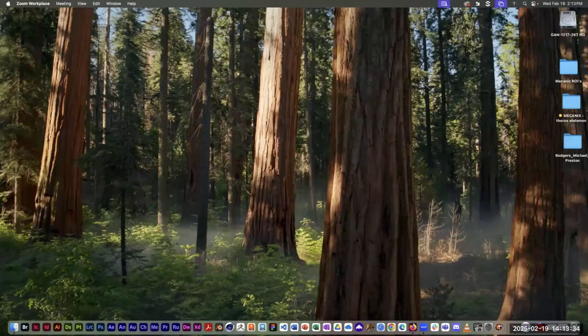All right, so I'm going to do two things today. First, I'm going to do a quick demo of something that may or may not be important to you in the future if you ever try to access a set of DICOM files in Horos. This would be particularly important if you ever work in the medical legal field and you're getting sets of DICOM files for various clients. I don't know that you'll remember this years from now, but maybe something will jog your memory and say, "Oh, Jim told us something about how to do this," and then you'll have to look it up again.